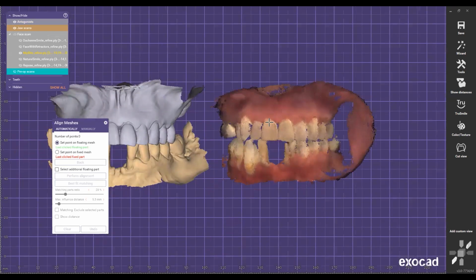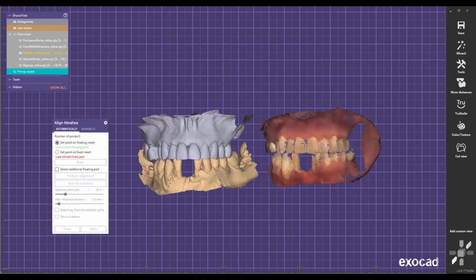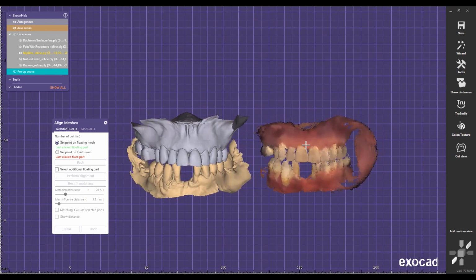We have a workflow that we have developed with our facial scanner that no other facial scanners on the market can do, and this is a huge advantage, having an option to acquire the bite with such a scanner, because we can nail the bite right away. That's the nice thing, especially for full All-on-X cases, full mouth reconstructions or dentures, and especially for those patients that come with very bad teeth, right? It's a challenge to scan the bite, especially with an intraoral scanner.